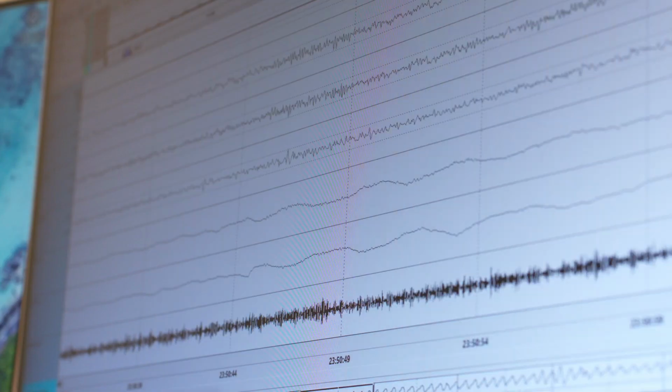Exactly, precisely. And here the patient still had their eyes open. Now they would close their eyes. We're here in an alpha rhythm of 8 to 13 hertz. The eyes are slowly starting to roll. That's a sign of great drowsiness. And when I see that here in my recording, then I know it's possible that the patient is about to fall asleep. But he doesn't.